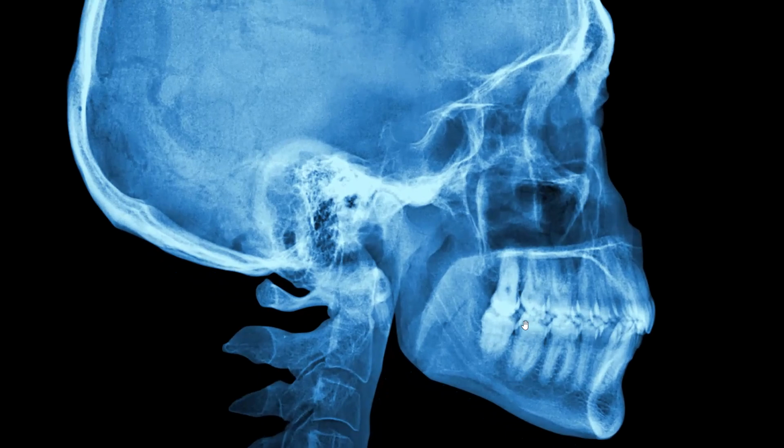the high density portion that covers the top of the tooth is the enamel, then the slightly less dense dentin around like this. Then you see an H-shaped lucency in the tooth. Okay, that represents the pulp chamber here.